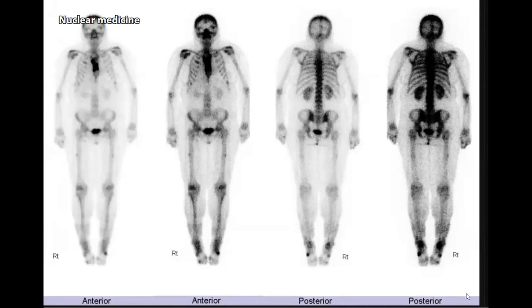If you start in the bone scan, you better try to comment on the renal uptake and soft tissue uptake. Then when you comment on this, you have to comment after that about the axial skeleton and the appendicular skeleton, and try to find symmetrical versus asymmetrical distribution of the tracer.